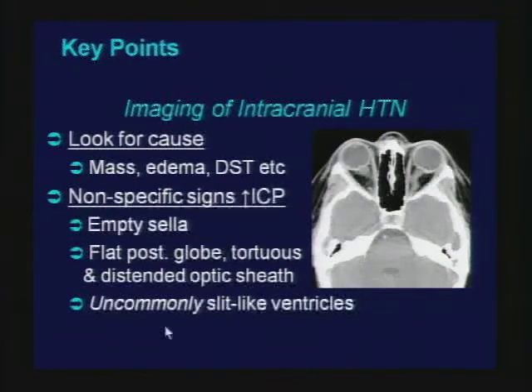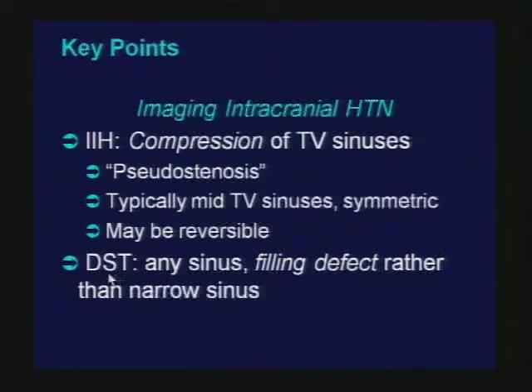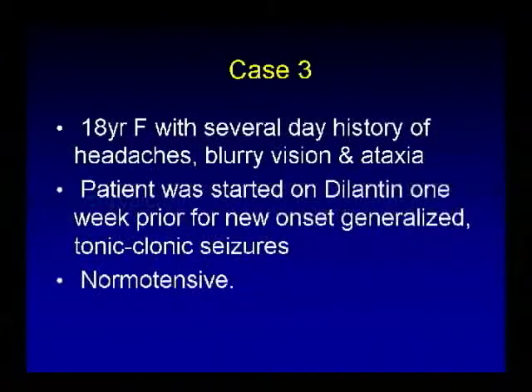We used to describe pseudotumor as having these slit-like ventricles. It's extremely uncommon to see that. Okay, so don't look for that as your main finding. This compression of the transverse sinuses, they are not focally thrombosed, they are compressed, giving this pseudostenosis, is very typical. And it is a compression of the sinuses at their lateral aspect. Remember with dural sinus thrombosis, and Ashley showed a beautiful case, I'm so glad she showed that to show you, it's a filling defect rather than a narrowing of the sinuses.